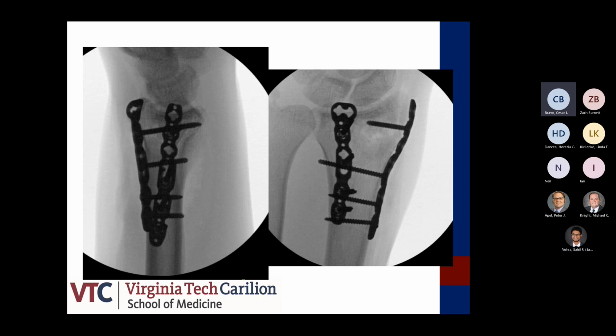And if you put it only on the first compartment, you've got significant comminution. That's just something to be mindful of, because you might need to contour the plate so you don't hyperextend that radial column. It's kind of subtle because the plate tends to be straight and our radial column is not straight. So that's something to think about. And the other thing is when you see these dorsal patterns, there's actually a new classification for these based on CTs that came out in 2020.